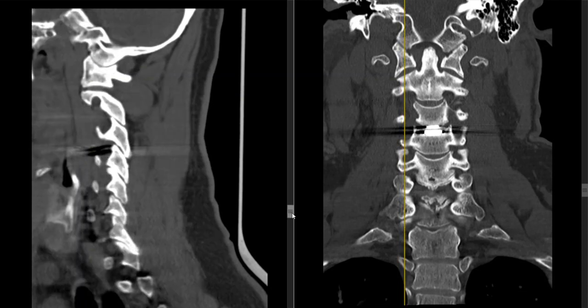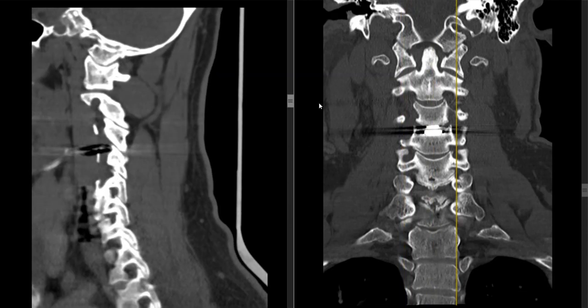But we go to the other side. So this is now your left side. You can see what's going on here as well. So you have a, God, you're my twin. This is exactly what I have going on. So I'm curious if you have a clunking noise around this area, clunking when you ever lay over a rolled towel, relax and get up, or even just laying over something anyway.